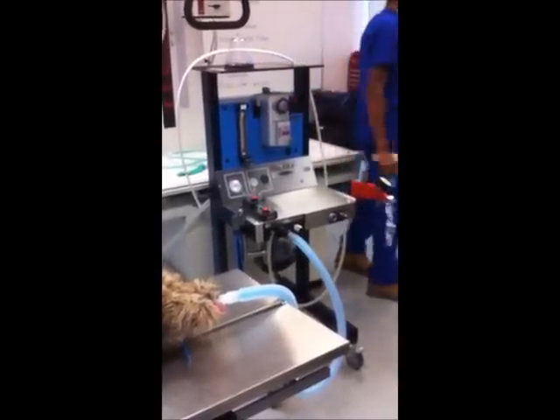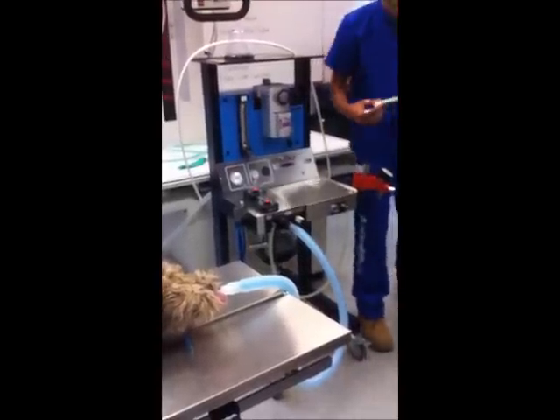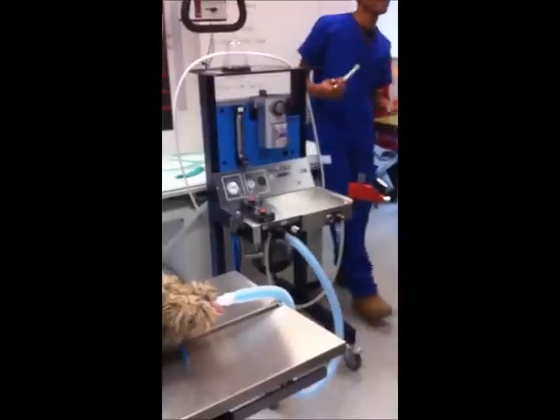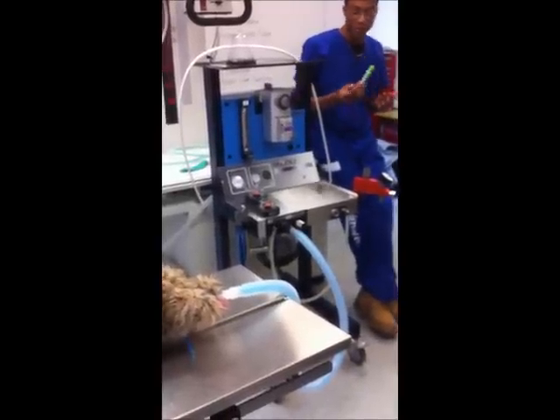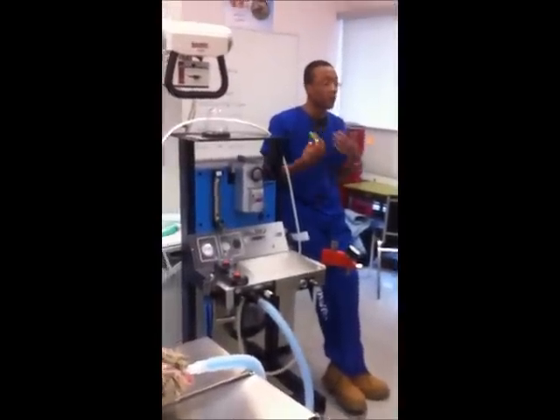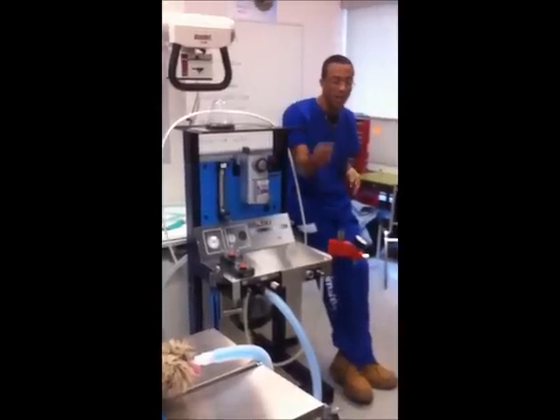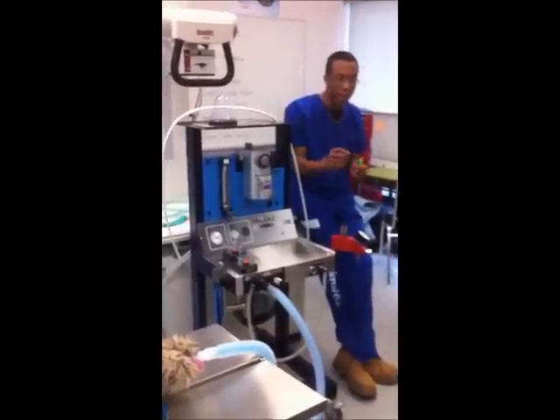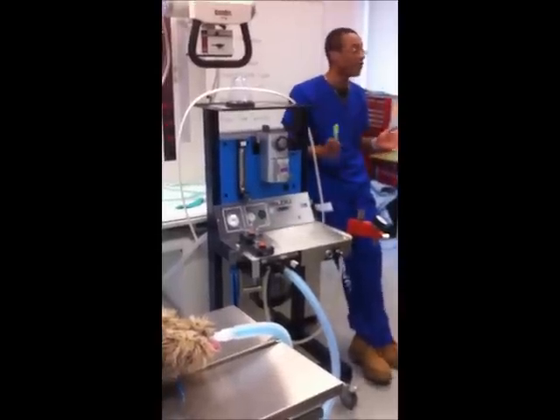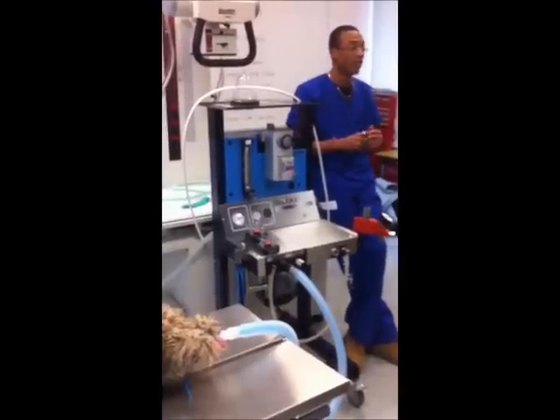No, not just that. Think of it this way: the rebreathing bag, the big balloon. Some of the fresh gas needs to go to the rebreathing bag. Remember when we said sometimes the animal might need to take a deeper breath? So the bag will help. If the bag has some fresh gas in it, the animal can take a deeper breath from the bag itself. When I was breathing through the tube, I didn't exactly know how that was working until I actually breathed through it. But once that bag closes off, you can't breathe in anymore. So if the animal needs to take in a deeper breath and that bag has no air, that's it. You can't breathe in anymore.